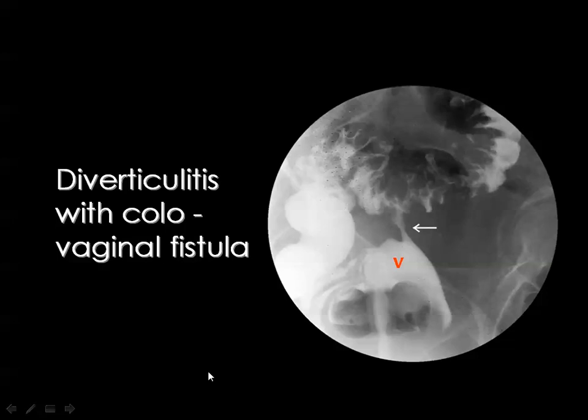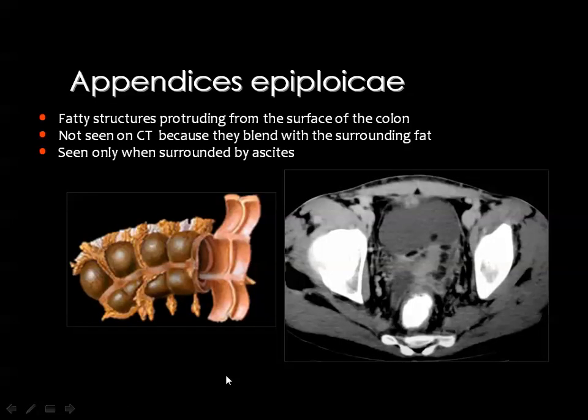And one of the common findings that are usually presented in the exams is you see a patient with colonic diverticulosis and air inside the urinary bladder. Then you know that this air is coming from the colon as a sequela of colovesical fistula, and this is usually the diagnosis.